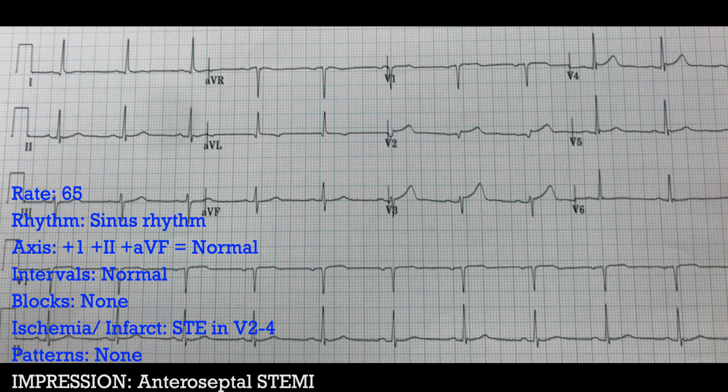And in fact, we did call the cath lab on this fellow, and he was taken to the cath lab, and turns out had a distal LAD occlusion, which seemed to be feeding the septum and the anterior parts of his heart. So, right call. Hey, even a blind hog finds a nut every now and then, as my grandfather used to say. That's a little more context than maybe we're used to doing here, but that's how to go through this particular EKG and some of the stuff we see on it.